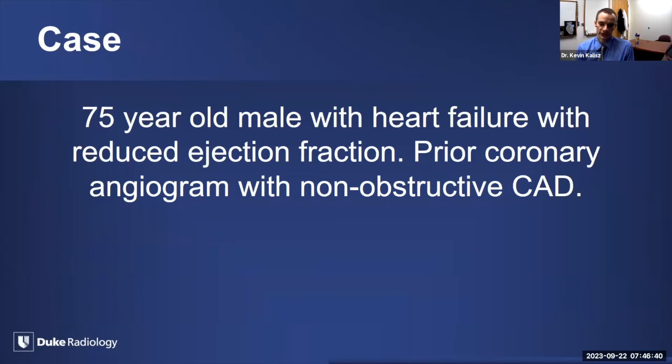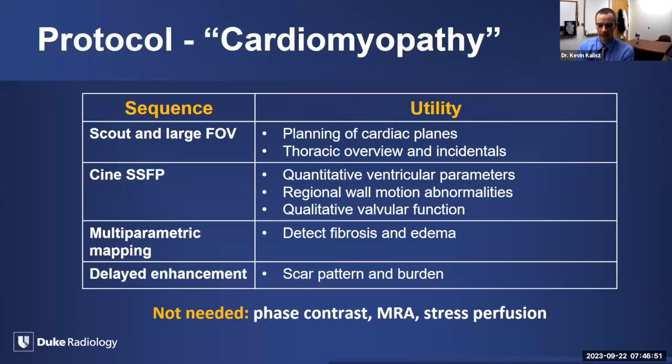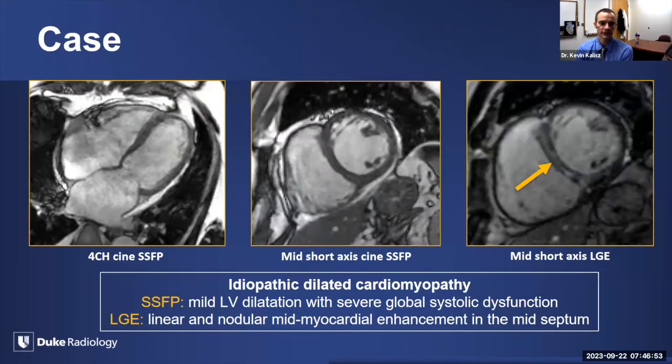75-year-old, heart failure, reduced ejection fraction. This patient has had a prior angiogram, which curiously showed non-obstructive CAD. So this is just a cardiomyopathy assessment, pretty much the standard protocol that we've been doing thus far.